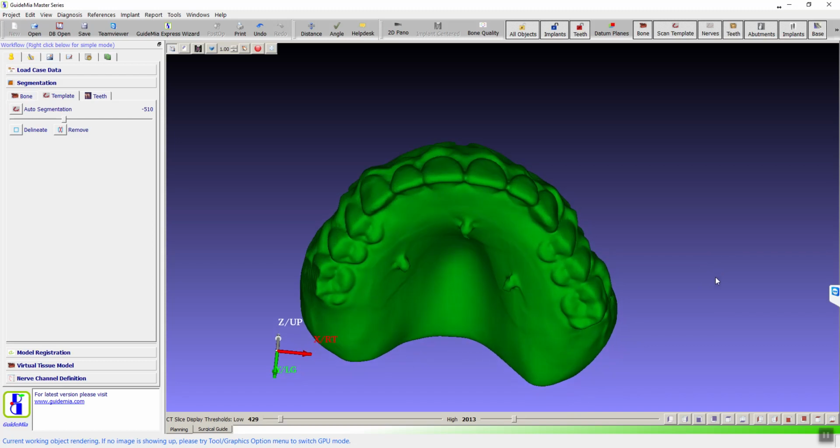So the SureMarkers don't have a flat surface, right? Just the spherical shape. Right, it's a little BB. I see. I would think they tend to have problems for surgical guide generation. I've used these with other software and I've never had this issue.